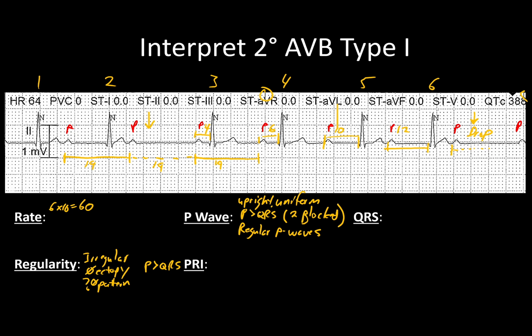So we've established we have the going, going, gone. We've gone 4, 6, 10, 12, drop. And of course that's small boxes. And we'll call that going, going, gone. Yes, I could do all the calculations and tell you exactly how many seconds or milliseconds each one of those is, but for what we're doing, just knowing how many small boxes they are, that's the important part.